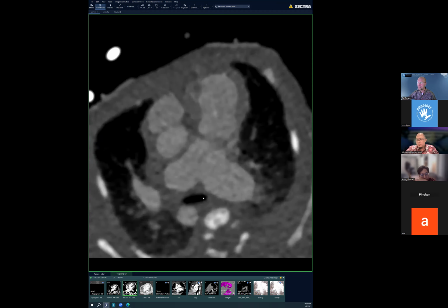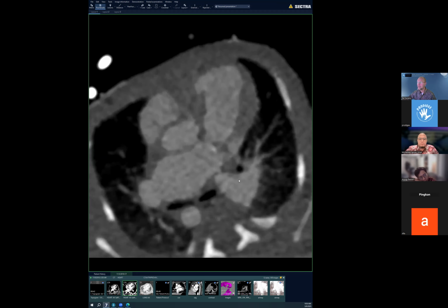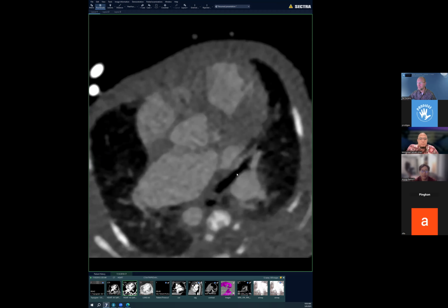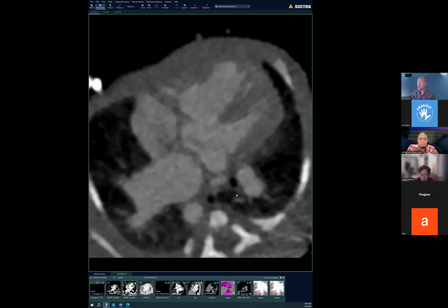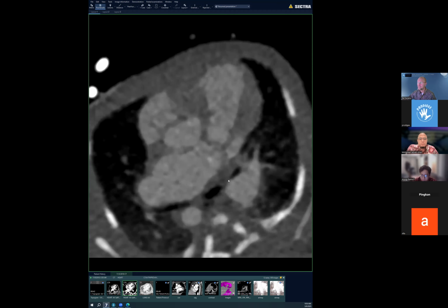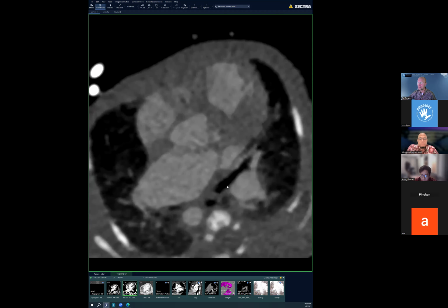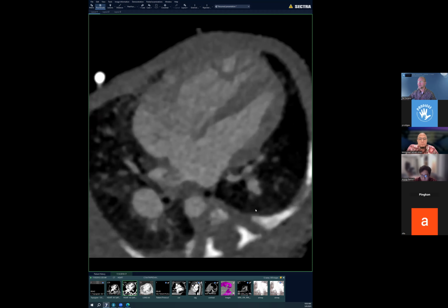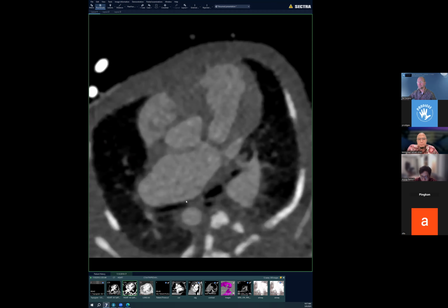On the left side, there's some compression. We do have a big left pulmonary artery as well, but the left main bronchus seems more normal. And you can see the left upper lobe bronchus as it's hyparterial on the left side. You can see the lower lobe bronchi here. So less severe airway narrowing, mostly involving the bronchus intermedius.